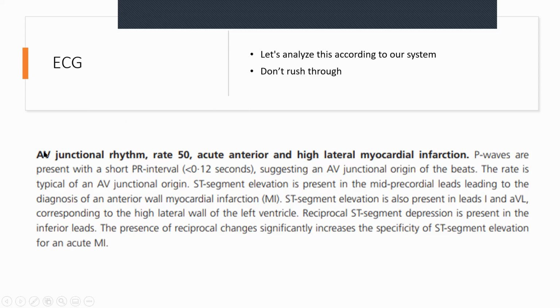So this is, you remember we were talking about how it looks strange, the PR interval and all of that. I don't want to get into this now, but this is a variation of something we call a junctional rhythm. Those who are following from last year, we covered junctional rhythms, in which we said normally no P waves. This is one of the cases where we do get P waves with the junction. I don't want you guys to worry about that now, right?